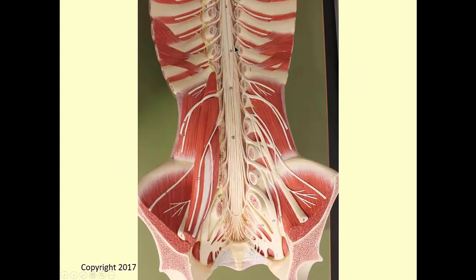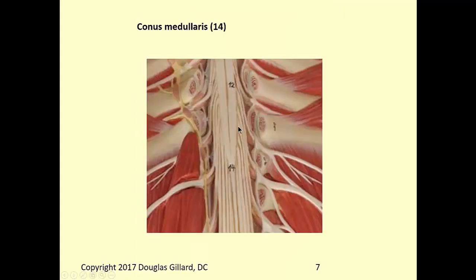And talking about the spinal cord, so here's the lower thoracic spine in this cadaver model, and here's the end. That's where the spinal cord stops, right up here between L1 and L2. What is that called? Let's blow it up. That's the conus medullaris. Remember? So all the spinal cord levels are actually, coccyx is here. L5 is way up here by T12 and T11, L4. That's where the spinal cord levels are. But the nerve roots are super, super long.